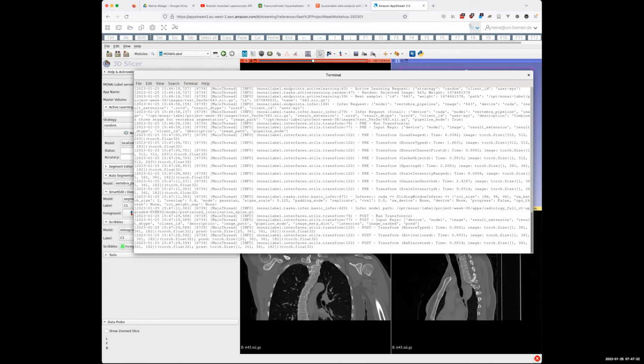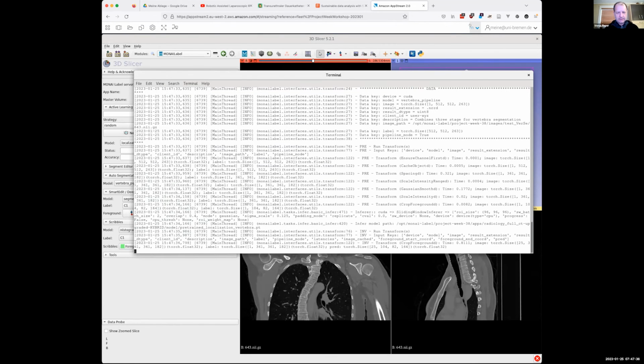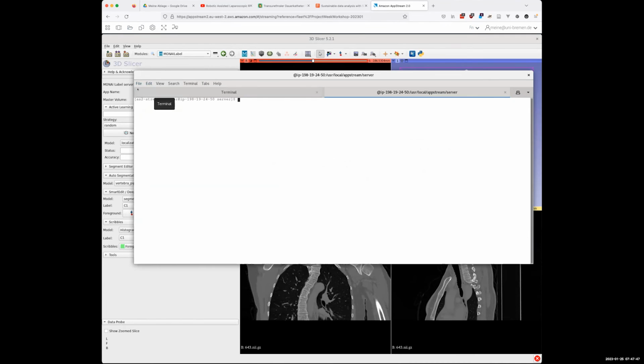Okay. Oh, you can open a new tab. If you click on the file in the terminal window. Here, yeah. Okay, it's a new tab. And if you want to monitor the CPU memory usage, just type htop, HTOP.